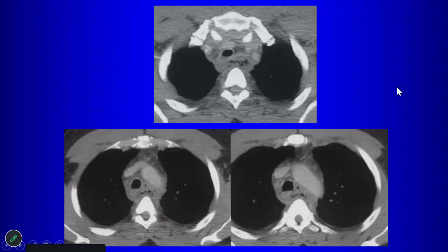So here's another patient with evidence of mediastinitis, right? We have these bubbles in the mediastinum, loss of fat planes. Of course, mediastinitis can be caused by surgery, right? If the patient's had surgery, sometimes microorganisms disseminate there hematogenously. But there is another important cause of mediastinitis that you need to consider, Boerhaave's, right? That can be associated with a left effusion, perforation of the esophagus. What's another cause of mediastinitis that you should also think about?